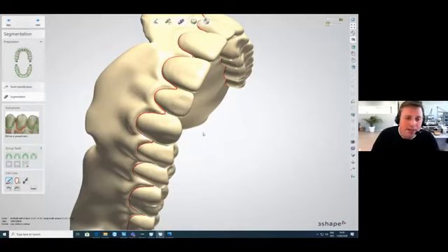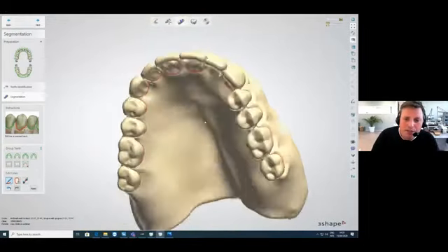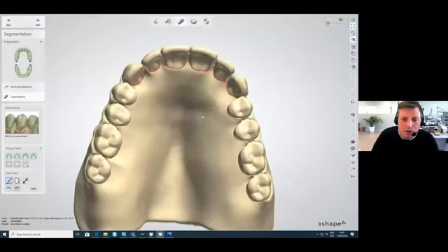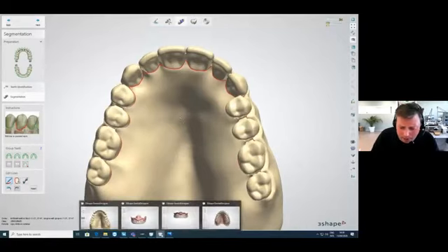Always be aware that if you use this feature, use a heavy computer, because there's a lot of calculation involved here, and if the computer is not really good, you will have some issues with it. So it's really important to use a heavy computer, a heavy graphics card, on this part. Normally you set this part, set a lower one, and I will show you what happened after that.